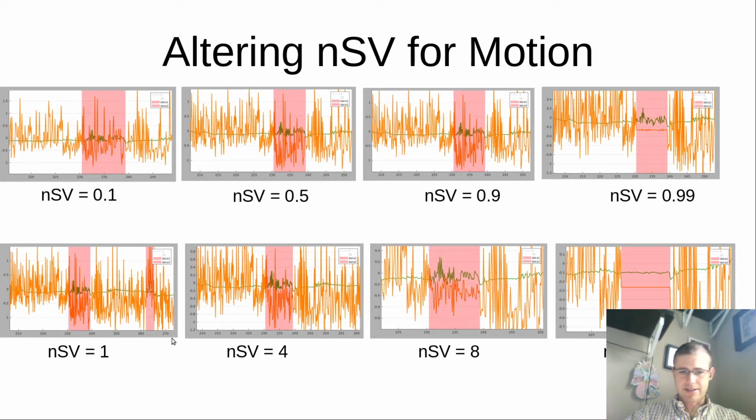You can also do integer values, and I do 1, 4, 8, and then up to 30. In this case, I actually wasn't even able to go to 40, and I'm assuming that's because I have a shorter time period, and therefore probably fewer components involved in it. But it's doing the same exact processing, just on a different range of data. In this case, you're not looking at the whole data set. I've had to zoom in on one particular location, and in fact, I had to use a different data set that had motion in it that would be flagged. I could have probably been more aggressive with my flagging of motion artifacts, but this was a little easier to do.